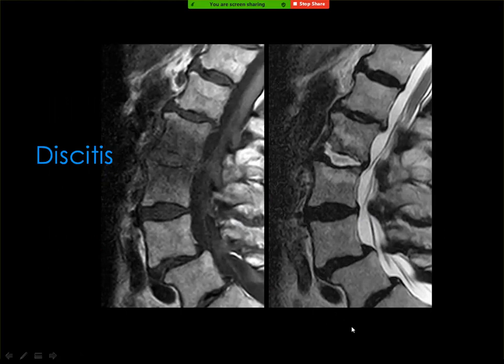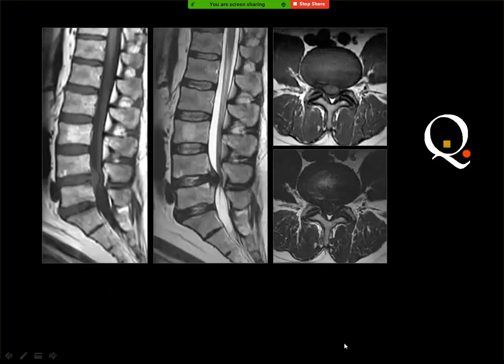vertebral end plates. Then anyone can ask, what about if the inflammation in the disc has healed? Then you get a black disc with residual bone marrow edema, which cannot be differentiated from type 1 bone marrow edema secondary to degeneration. And at that time, you do not need to differentiate because both conditions have no specific treatment and they do not require any further evaluation.